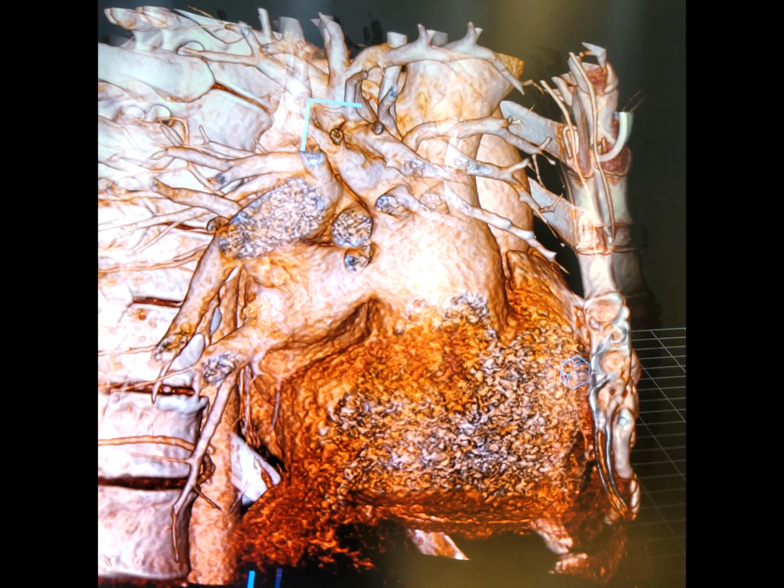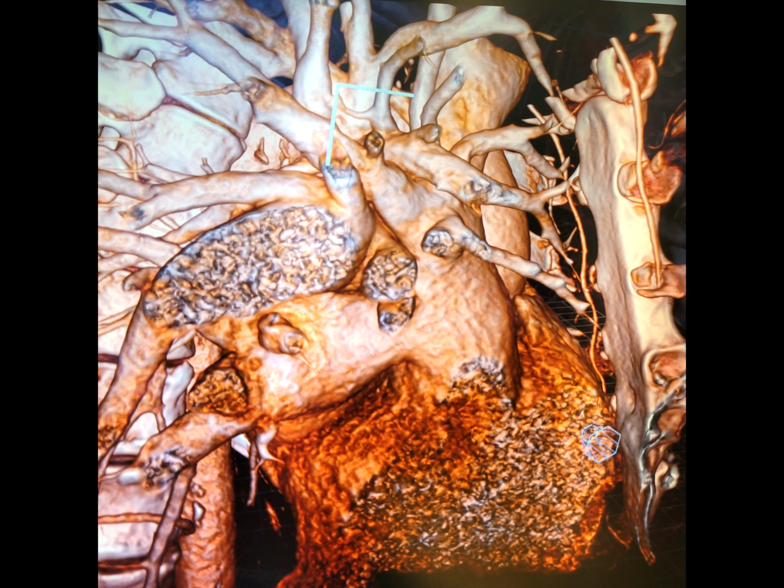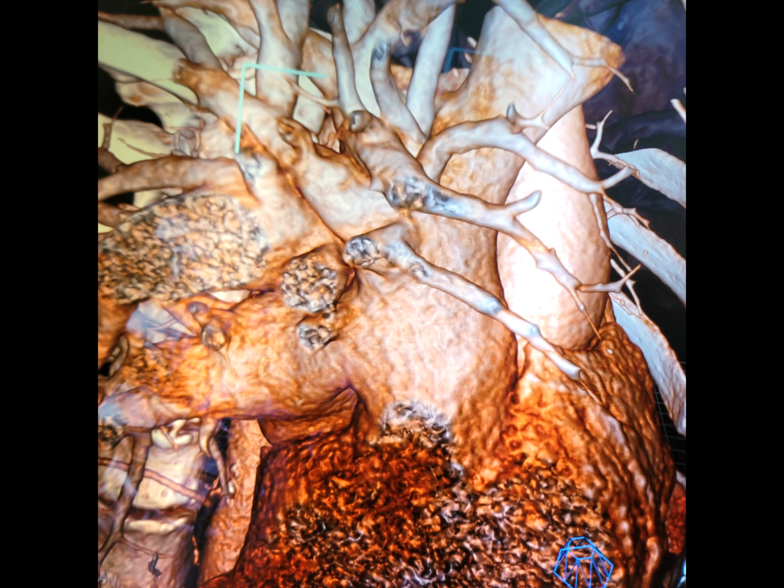This view further illustrates the spatial orientation and location of the pulmonary veins into the different aspects of the SVC as it joins the RA junction. In this picture, the spatial orientation of the differential pulmonary drainage is well appreciated. You can also appreciate the change in caliber of the superior vena cava as it reaches the right atrium as more and more pulmonary veins drain into it.